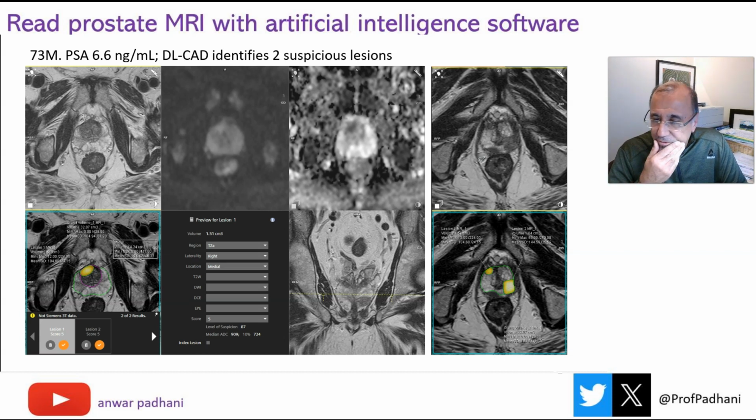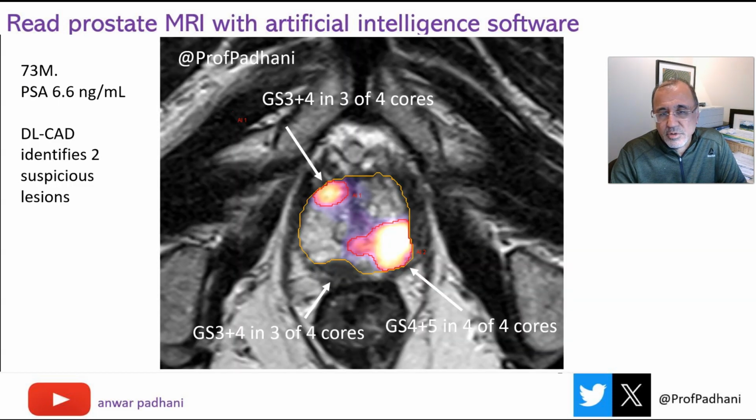The outlining of the gland is in fact quite important. Here's an example of multifocal lesions in the prostate gland in a 73-year-old man, and you can see the AI identifies 2 lesions. Both of them it classifies as having scores of 5, in other words, like a PI-RADS 5. And you can see this is 1 lesion over here, this is 1 lesion over here. But what you notice is that there is a 3rd lesion here at the right prostatic apex. But the AI completely misses this because the outline is here.